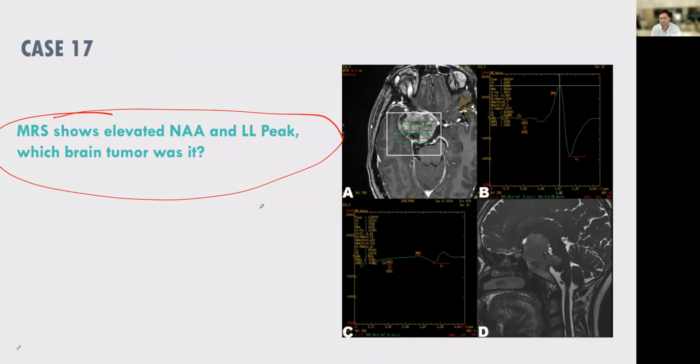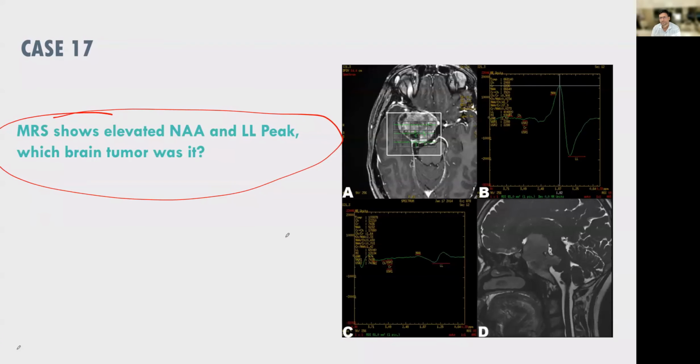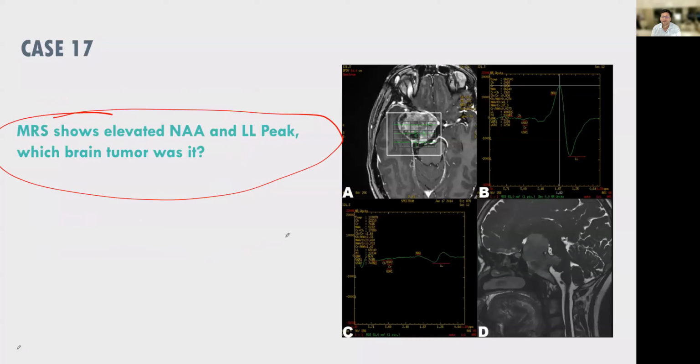This is the lesion. Is it an infective lesion, inflammatory lesion? Somebody said it's not a brain tumor. If not a brain tumor, what is it?